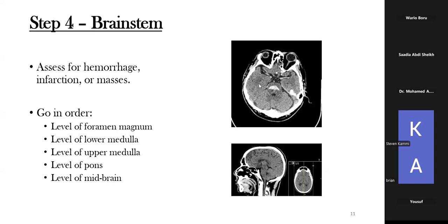So it's within the brain matter, most commonly near the poles. So you'd see it right here near the temporal pole or near the frontal poles or the occipital poles. And the reason behind that is, remember the brain is floating here, but when it's impacted suddenly, it hits the front and it hits the back. From that injury, from that bruise, that's what we call a brain contusion.